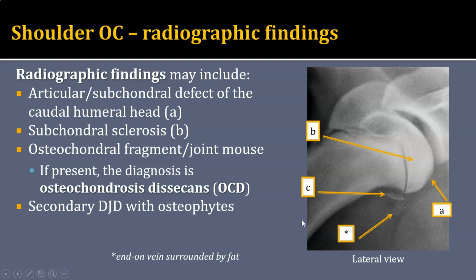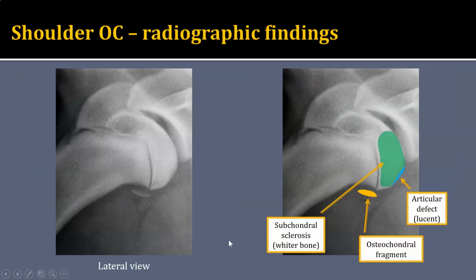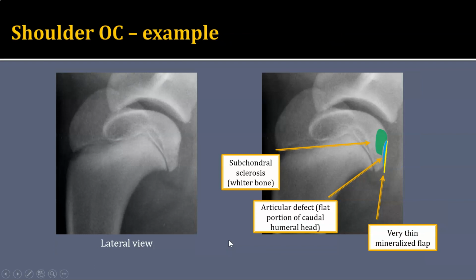The joint likely has some joint-related soft tissue swelling, but in the shoulder, it is very challenging to identify soft tissue joint-related swelling. If it were really severe, we might be able to identify it, but typically we do not. This is that same patient, just with more shaded labeling for your review later. This is a different patient, same lateral view.